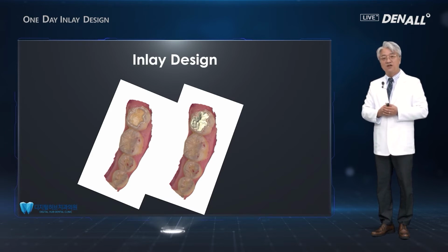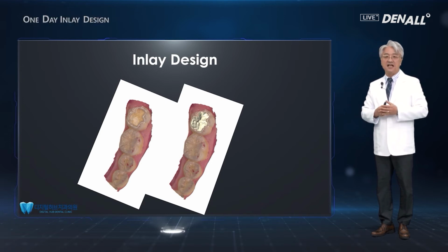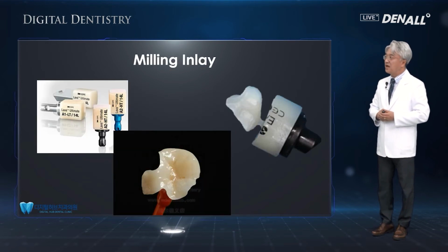But now, with the usage of the 3D printers and 3D printable resins, we can now deliver good strength and long-term stability. And now the type of products are becoming available on the market. So today, milling inlay and printing inlay, these two will be what I'm going to explain to you about one-day inlay design. So with this designed inlay, let's now talk first about the milling inlay.